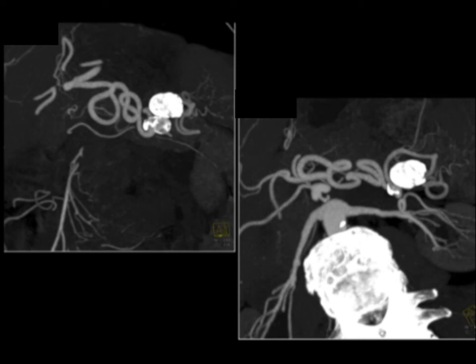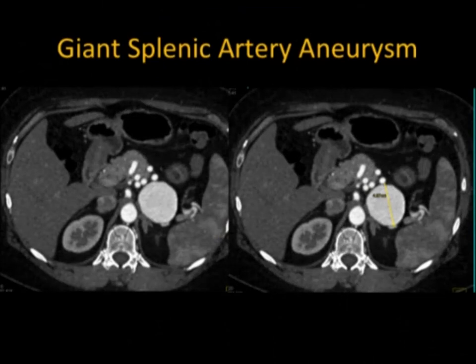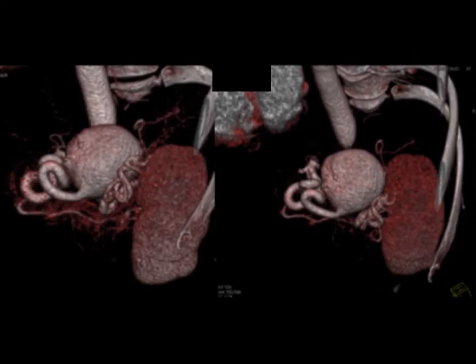Of course, if the aneurysm is incidental like this one, but is measuring close to 5 centimeters, there's no great magic. The only decision here is, can I embolize or do I need to resect? You have an aneurysm this large, the risk of rupture is way too high, and this will indeed be removed. Now, I mentioned the cases we do worry about also in terms of growth of patients with comorbidities like cirrhosis.